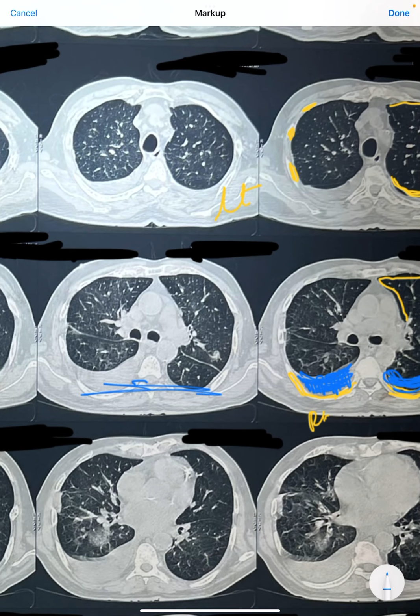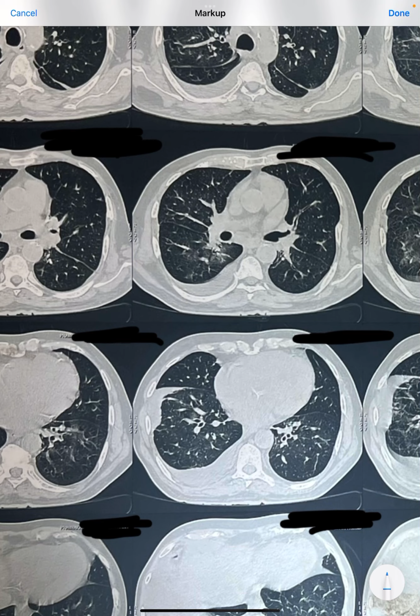So this is free pleural effusion, free fluid, which will move if the patient moves. So this is all free fluid, which we can see. This is pleural effusion. But what we see in the other images, when we look here, we know that this is free pleural effusion, which is accumulated here, but there is an accumulation of fluid above here. So this is fissure basically. We can very nicely make out fissures, which actually divide the two lung lobes. So this is fissure, which you can see. This line is all fissure.